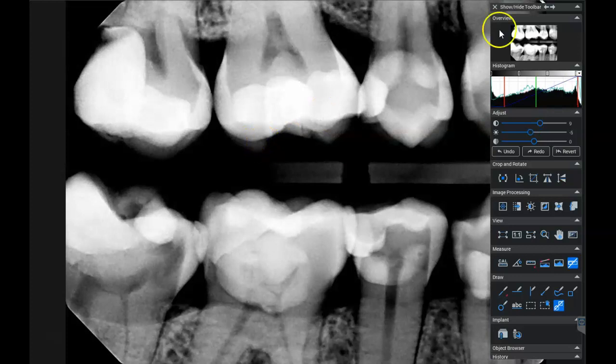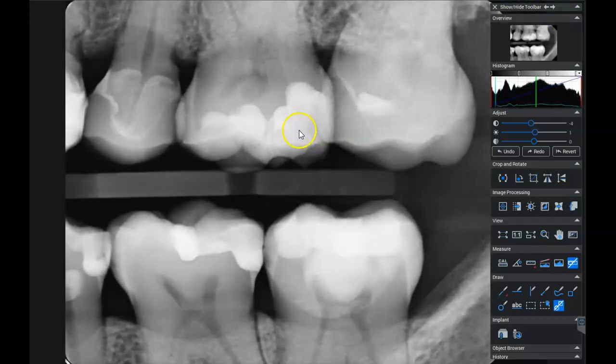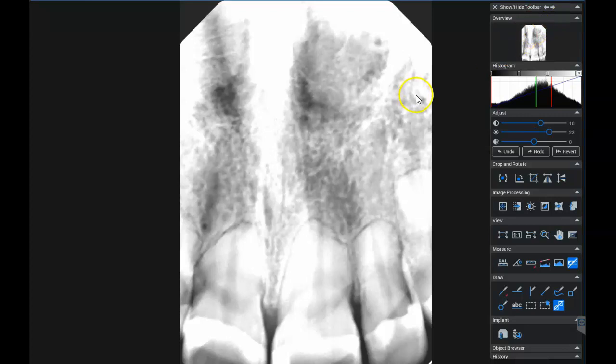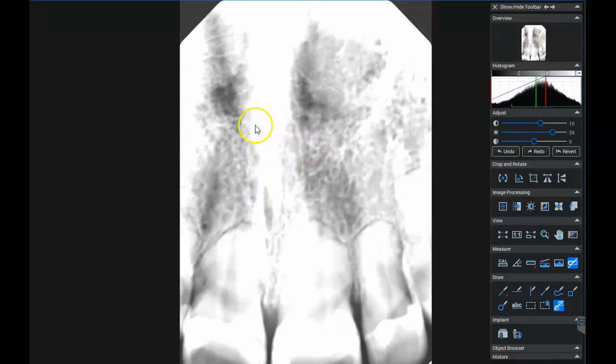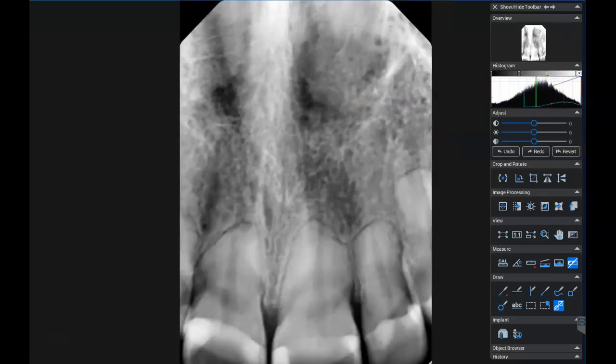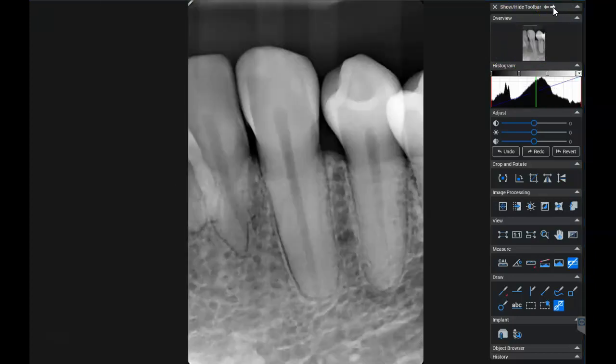So something is completely disconnected with the resolution editing feature between the thumbnail and the actual picture that is shown.